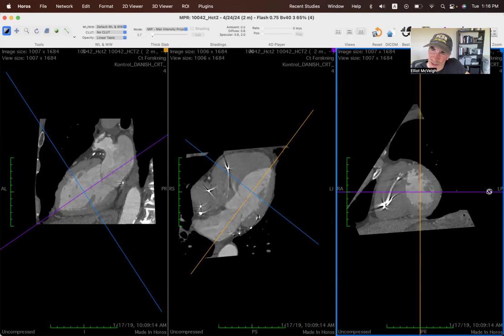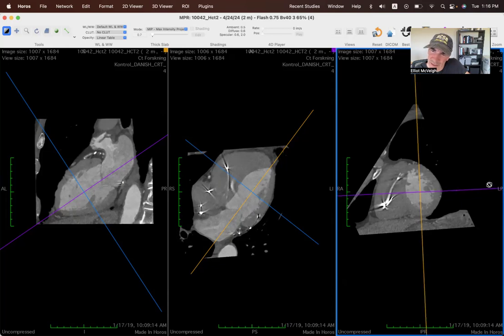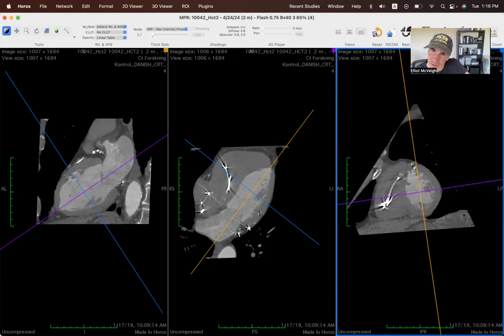To get it into the cardiac view, I would rotate it just a little bit that way, such that there's a sort of symmetry between where the right ventricular free wall comes and hits the left ventricle here and here, such that I'm sort of parallel to that line. That angular rotation will set up a point in this image. This is the yellow image, right? This point right here is the same as this point up here. And that's what I'm going to mark as the anterior position, right?